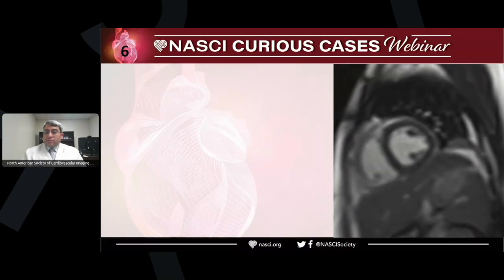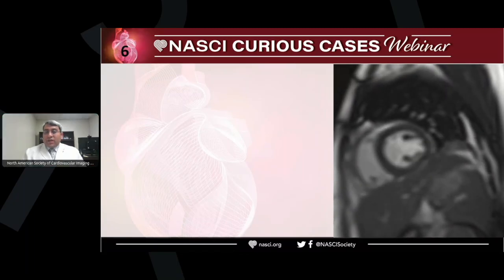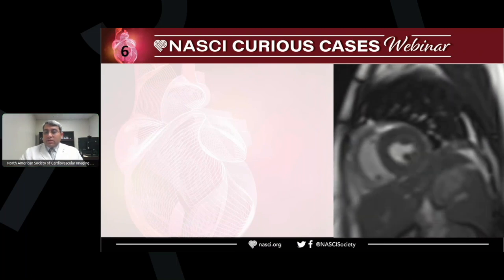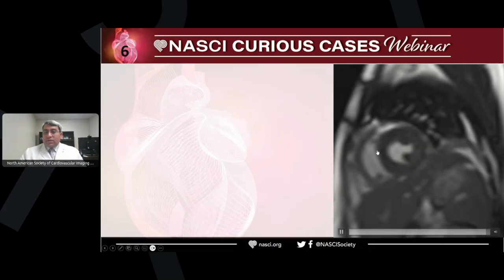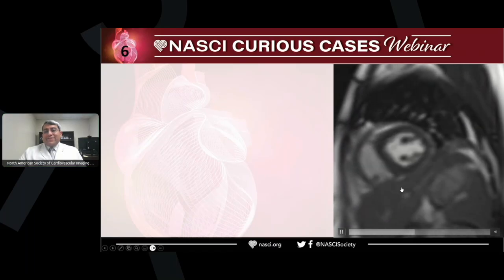Looks like the little septal bounce. Yes, perfect. And what happens during inspiration? Was it the interventricular dependence? I think it's a technical term, but it becomes flat.